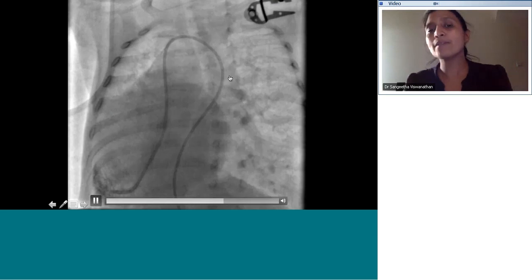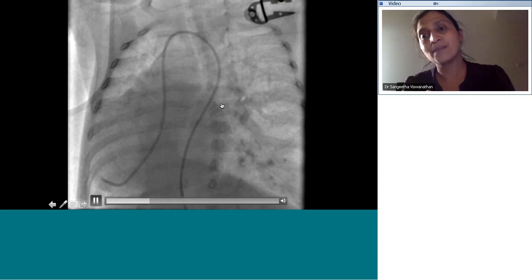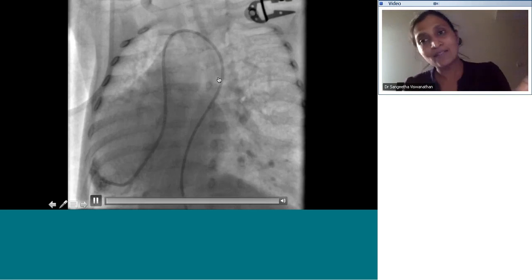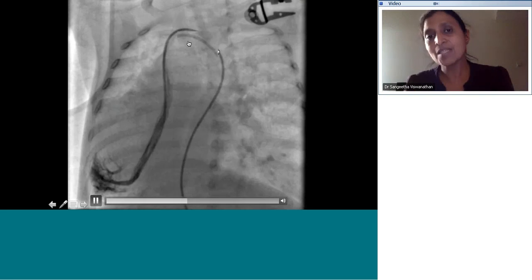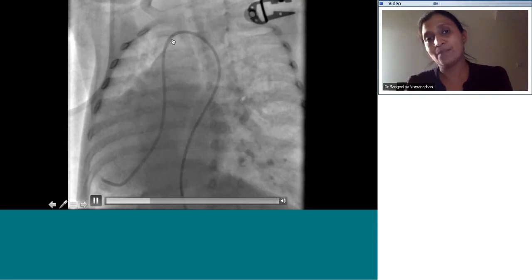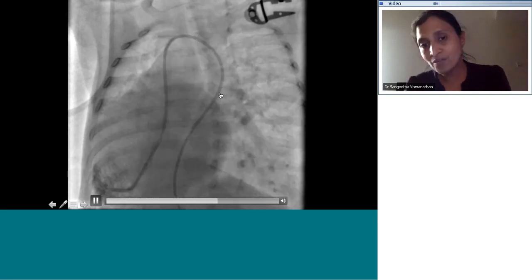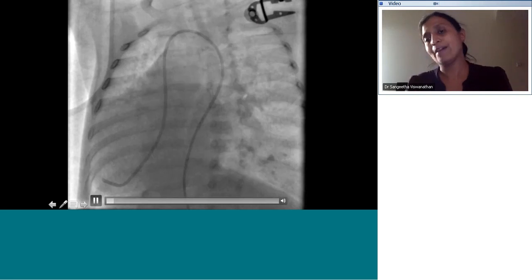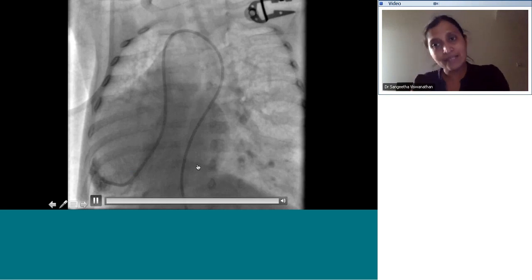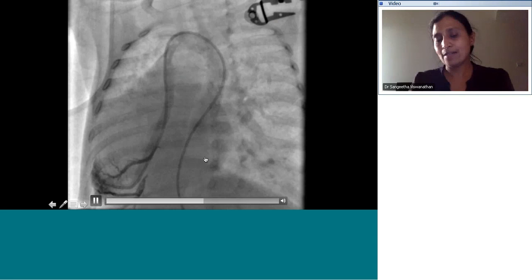So what happens in situs inversus? Where is the SVC? It is inverted, right? So this is the left-sided SVC. This is the innominate vein, the right innominate vein. And this is an anomalous pulmonary vein draining into the right innominate vein, left SVC, left-sided right atrium, and IVC. So patient with situs inversus and dextrocardia. You understand that, right?